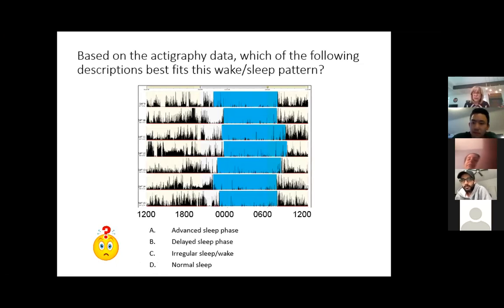But again, like I do with PSGs and hypnograms, I would imagine myself talking to the families and showing them this actigraph, because remember what I called it? I called it a truth buster. And I would sit down with the families to describe this. And then I just want to point out, see right there? Can everybody see that? That was the device was probably off for a shower or a physical activity.